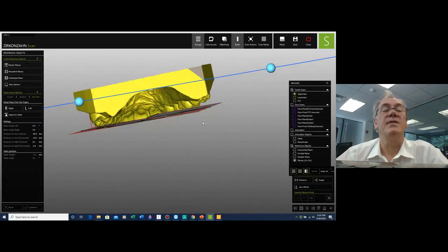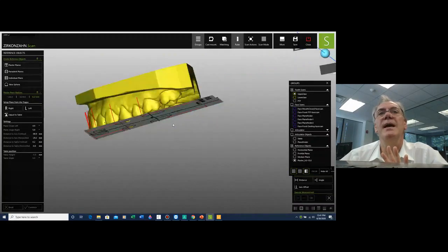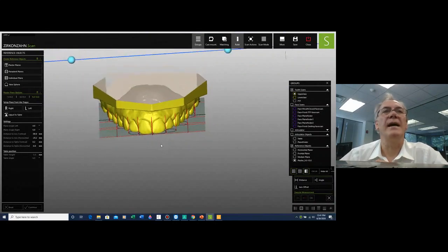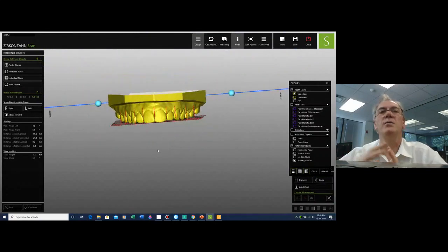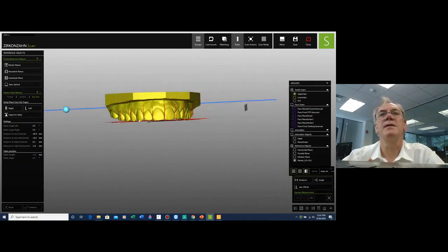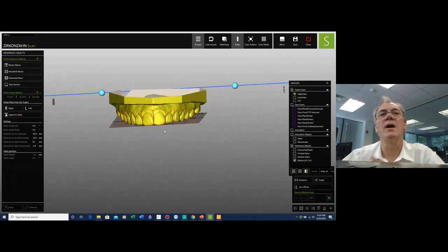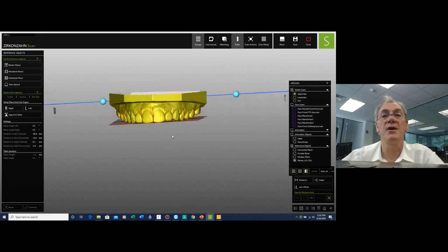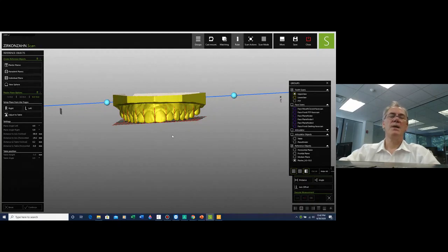And it actually happens very, very often. So it's also very important to be able to have these elements under control when we are doing a setup, or any type of rehabilitation that relates to fixed prosthesis, dentures, or any type of implant case. Being able to individualize the different angles of planes of occlusion, left to right, and believe me this happens very, very often, is fundamental for the functional part of what we're doing, and sometimes certainly also for the aesthetic part of what we are doing. So I've set it up.